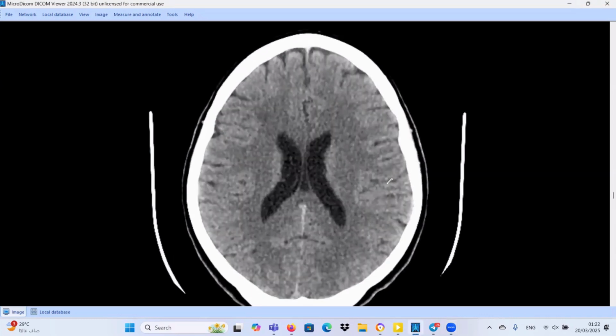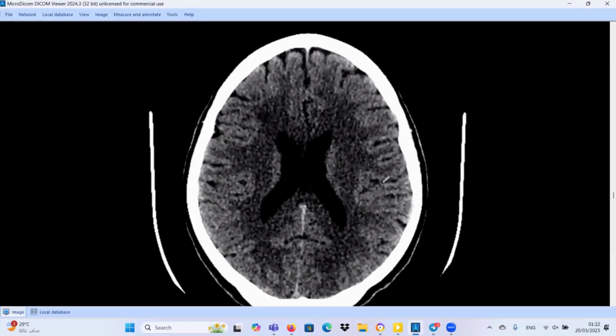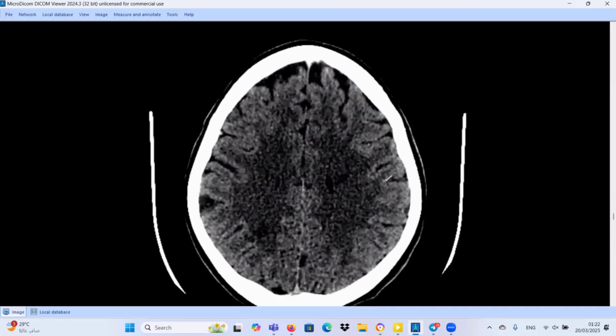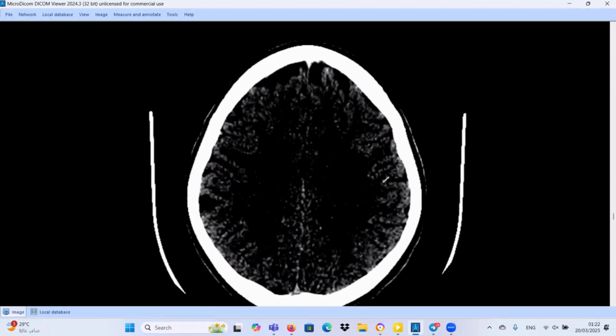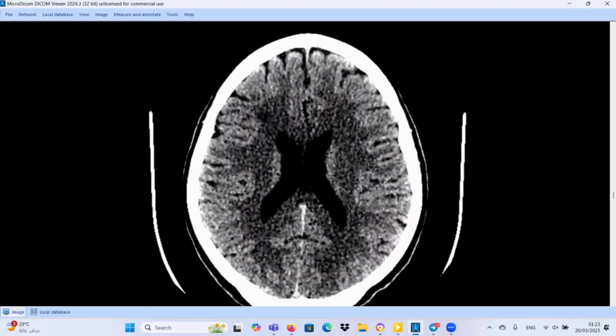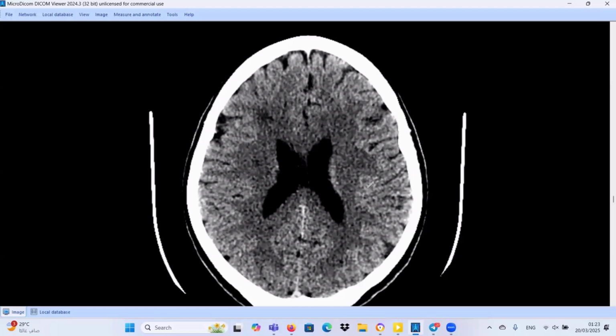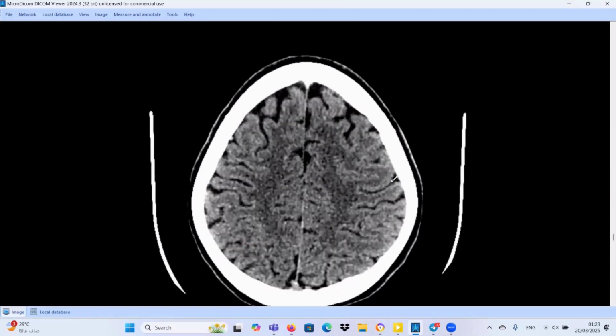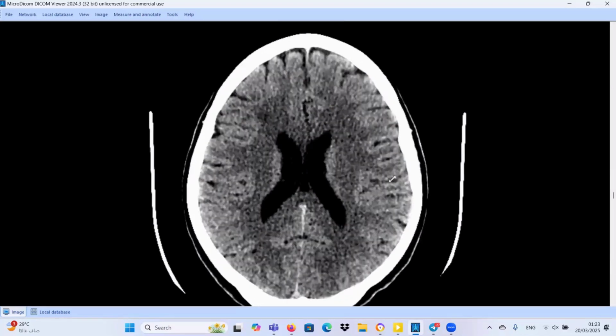Let's go more to the white matter. Let's change our window to make it a little bit of a stroke window. I know that the stroke window is noisy, but sometimes it is helpful. I think now it's more clear to have something here. Periventricular involvement. Also, this one is more obvious now. And also this area is very obvious. So for me, at the time, there is something wrong in the white matter. I couldn't pick up any more abnormalities. Really, these areas are a non-specific finding.